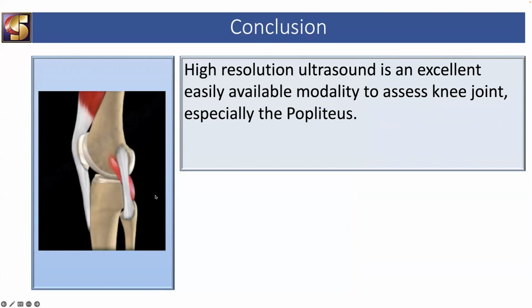Coming to the conclusion, high resolution ultrasound is an excellent, easily available modality to assess the knee joint, especially the popliteus.